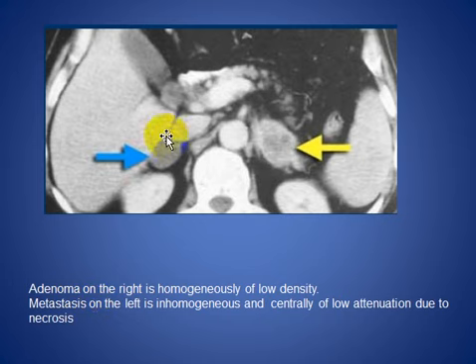There is an adenoma on the right side here, with low density, but there is also a metastasis. It is an enhancing mass with a low attenuation area due to necrosis, consistent with metastasis.